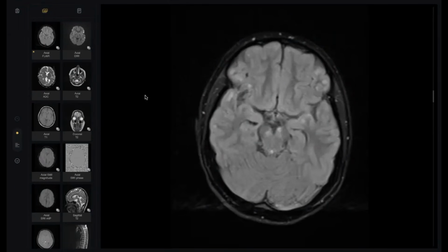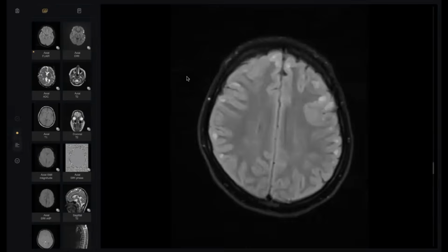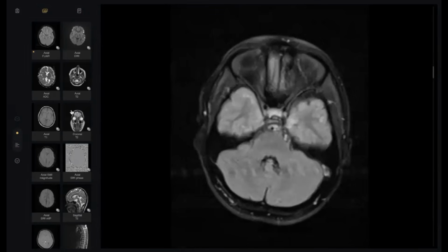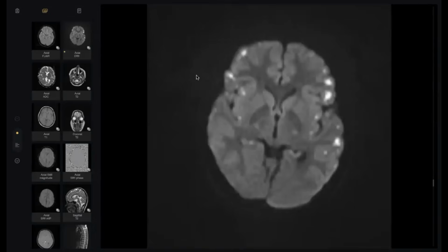I was aiming to go into more and more differential diagnosis, how to exclude, how to include. What happened here? The patient has fever, and really, this is a very atypical case. Our doctor looked here. She finds this all abnormal peripherally, cortical and subcortical signal intensity. Then she asked for T1 to rule out hemorrhage, but you make a mistake. You ask T1 and susceptibility. The examiner will not give you 2 sequences to rule out hemorrhage.